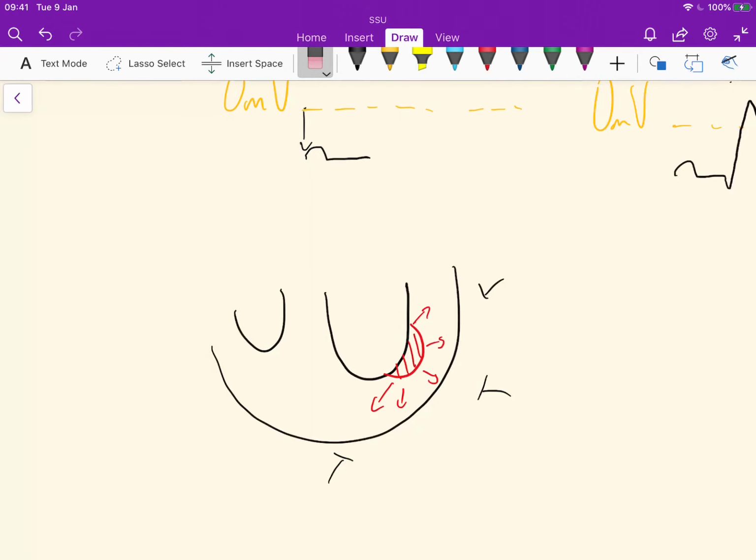is going to be looking at a part of the heart that's supplied by a different artery, compared to a lead that's over here. So what that means is you can't localize NSTEMIs, which isn't too much of a problem because the treatment for NSTEMIs is medications.